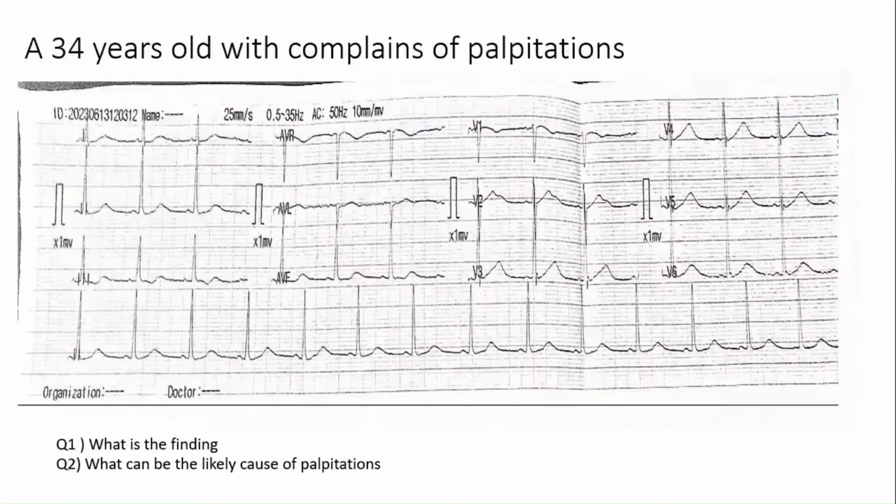34 years old who complains of palpitations. He comes for a review, and this is the ECG. So what is the finding and what can be the likely cause of these palpitations? I think it's more of a spot diagnosis. You just have to pick that.